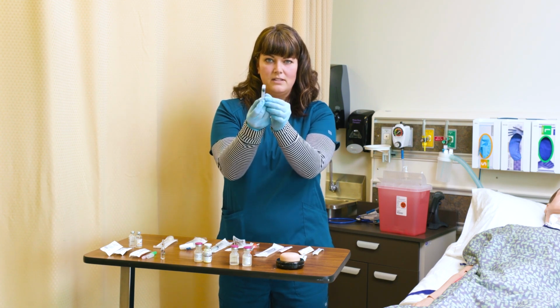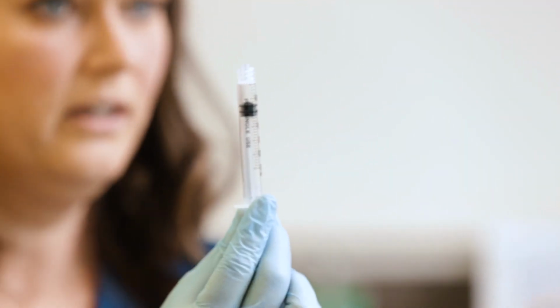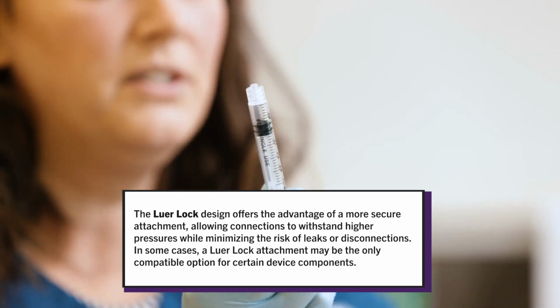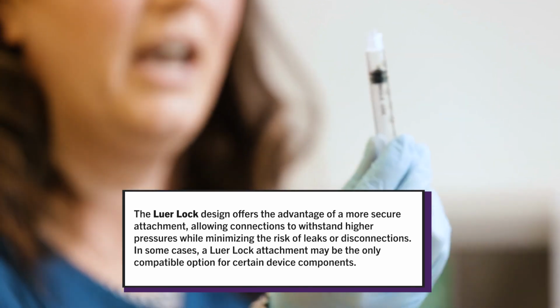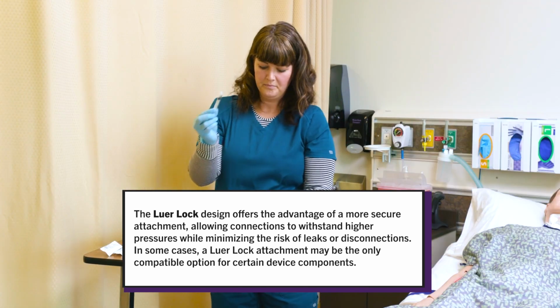Now see how the end of this is different. It's got kind of a screw looking type tip. That is called a Luer Lock. Many syringes or needles are made to interlock and tighten on there so that the needle doesn't come off. That's called a Luer Lock.